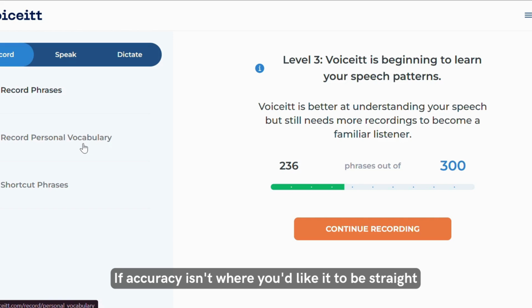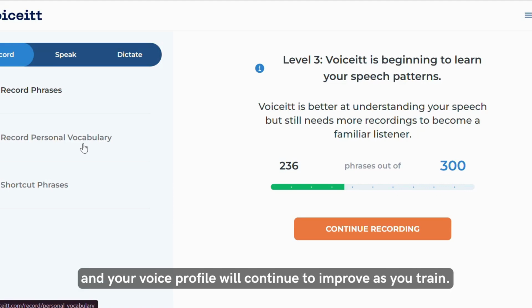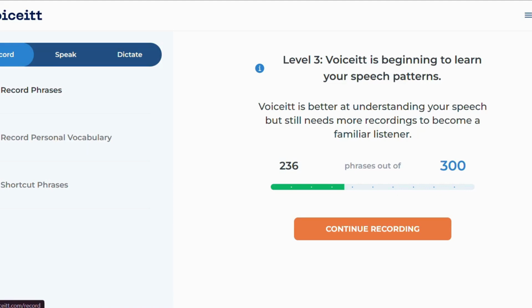If accuracy isn't where you'd like it to be straight away, continue adding more recordings. Voiceitt learns from the examples you provide, and your voice profile will continue to improve as you train.